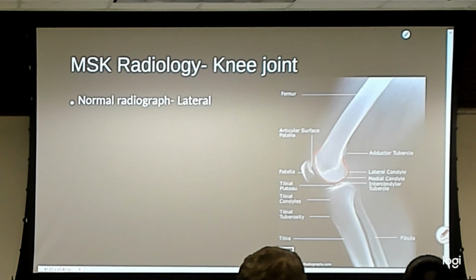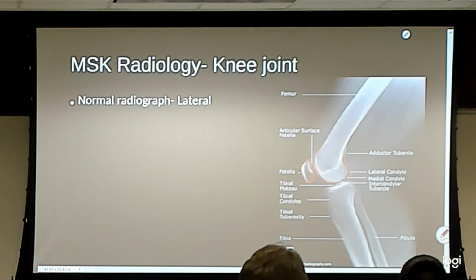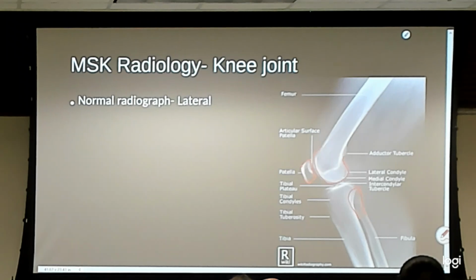Yeah, not actually. Okay, then we go patella. This is the one dimension. The patella is not shaped like a triangle. The proximal fibula, it doesn't help us as much as it did in that AP, but here's our proximal fibula. The tibial tubercle or tuberosity is this bump right at the front.